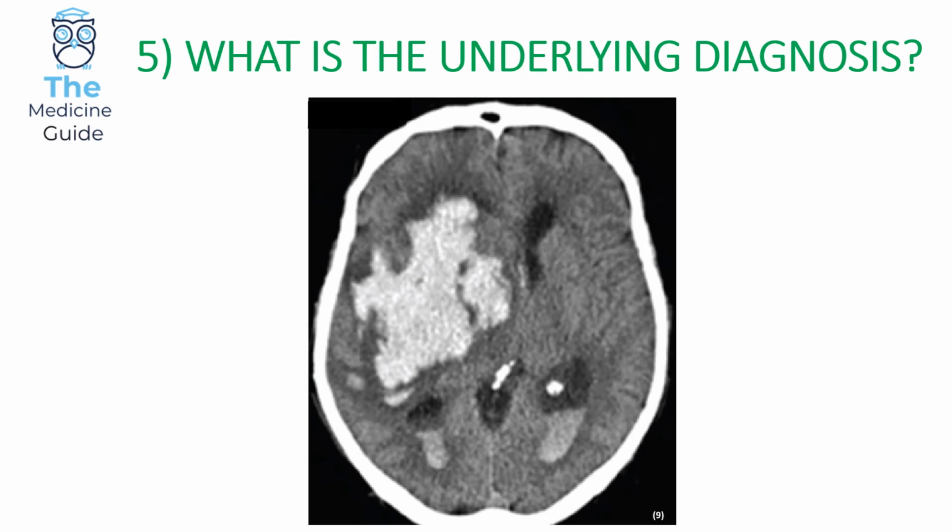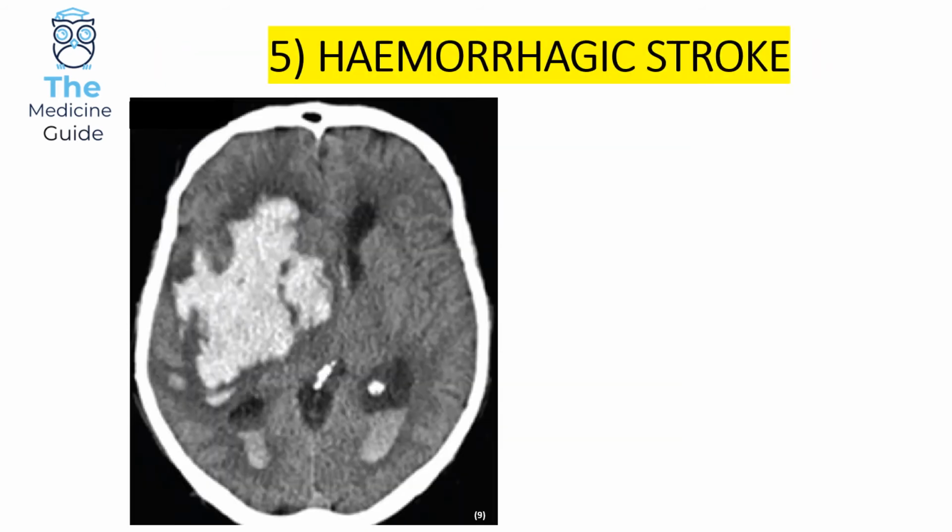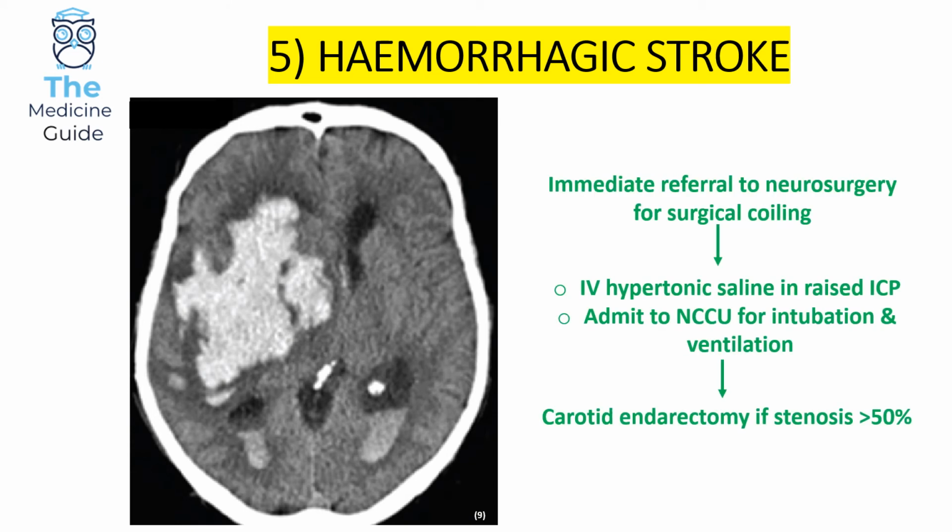Okay, let's have a look at the answer. So this is an example of a hemorrhagic stroke. Now, a hemorrhagic stroke will be managed by the neurosurgeons.